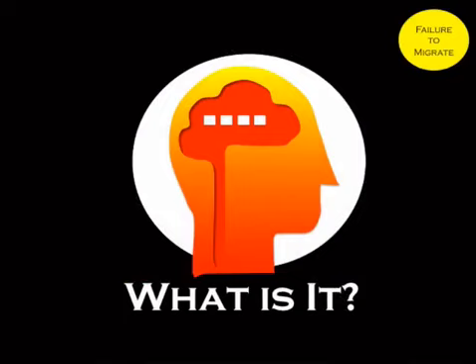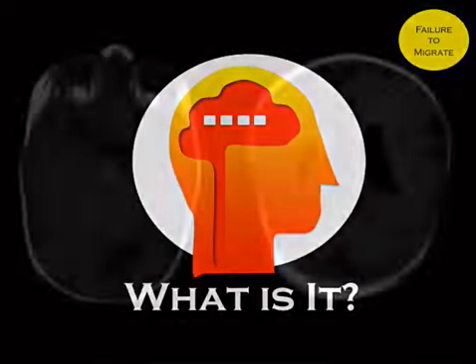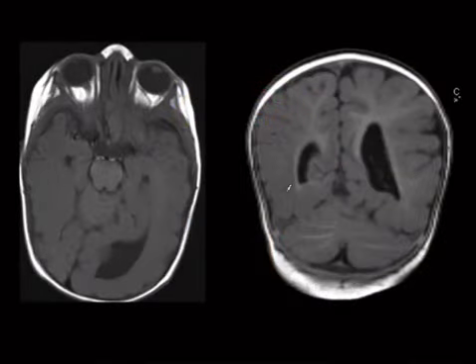So now let's do failure to migrate. This is our third type. So we've got an axial and a coronal brain MR, and what you're noticing is that this part of the brain appears big over here, like fat, like this guy's been lifting weights, this guy's been sitting on the couch. But this ventricle is big, so big brain, big ventricle, as opposed to the ventricle being smaller and bigger on the other side.